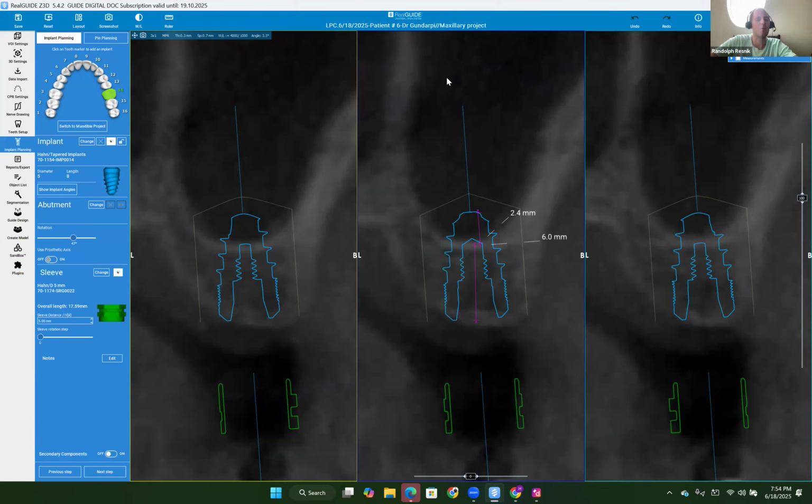But what's going to be difficult with the lateral wall in this case is the patient has a very thick lateral wall, and it's also a single tooth lateral wall. So you have teeth on both sides, which is going to be very, very difficult because you have to make a very small window. Now, if this patient had significant parafunction, they didn't have a tooth distal to it, then we might be looking at doing a lateral wall with it. But for this one, a crestal SA3 implant placement is going to work out well.